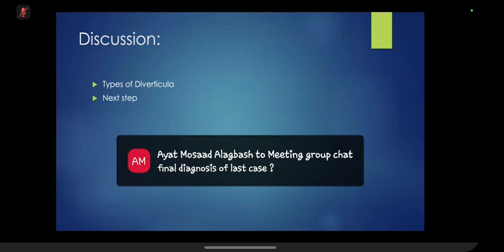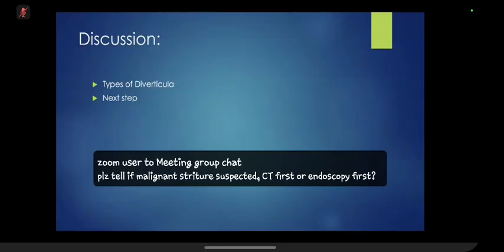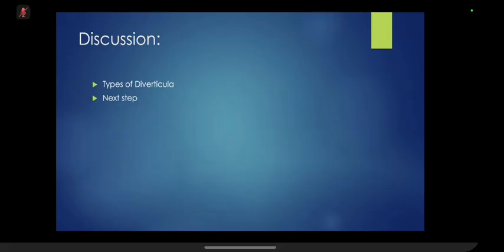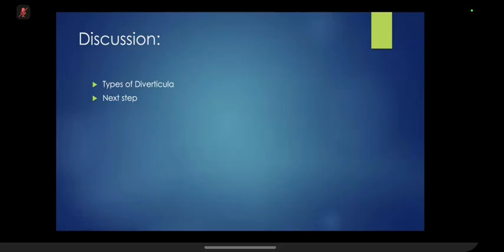These are the cases which I'm showing from real-type scenarios, because the examiners are not showing us the bookish cases anymore. They are showing us cases which might not be a single pathology, which might have a dual pathology or additional findings. So just to make you people aware of these kinds of fluoroscopic images and cases, so that you don't get confused when you present in the real Viva sessions. Try to engage in a lot of discussions with your fellow colleagues about any of the cases, not just fluoroscopy. That will give you more confidence.